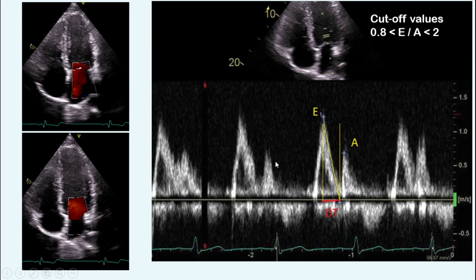We know that mitral valve inflow is a preload dependent factor, meaning with changes of the heart rate or blood volume, like when the patient respirates, the inflow will change, and the Doppler changes a little too, as you see in these four different envelopes.